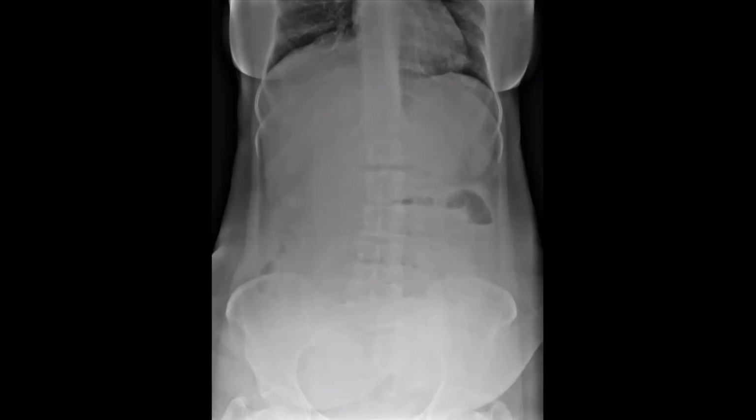I would like to correlate with the history of the patient: acute abdominal pain. Appearance of the string of pearls sign with a small... Yeah, you're right. String of pearls sign, what does it mean? It means small bowel obstruction. Yes, you are right. Very nice. I would also proceed with contrast-enhanced CT abdomen and pelvis.